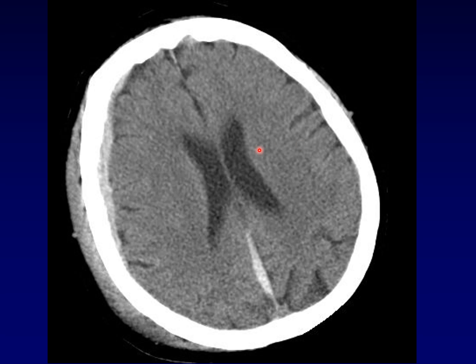Here's a different type of hemorrhage. This hemorrhage, although it is still convex relative to the skull, it is now concave relative to the underlying brain. This clot is not pushing nearly as hard upon the brain. That's because it's a venous injury and it occurs in the subdural space. So when you see a crescentic configuration to hemorrhage, you know you're in the subdural space.